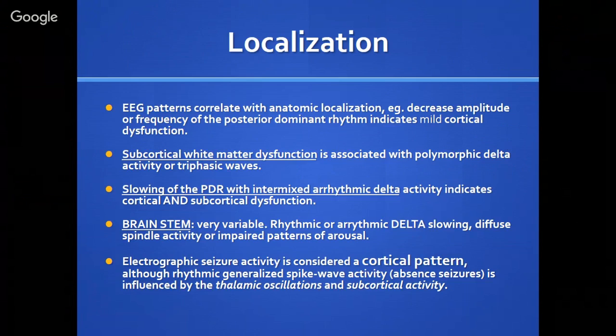So normally when the eyes are closed, there is this alpha-like band activity like 8 to 12 hertz in the occipital regions, and there is a gradient.